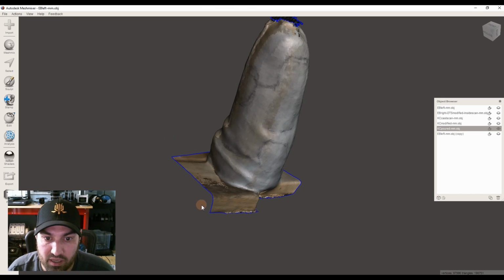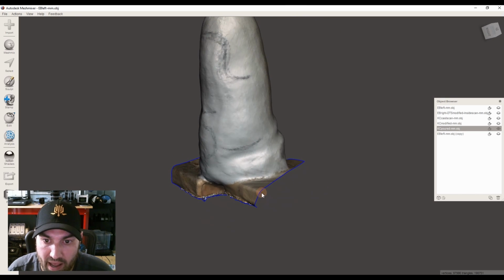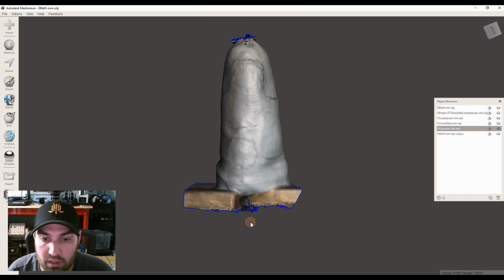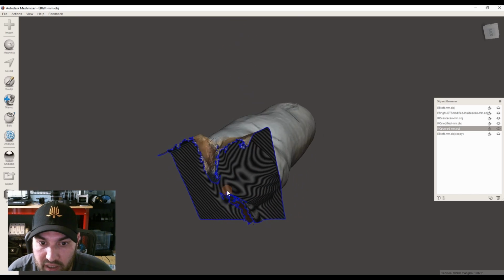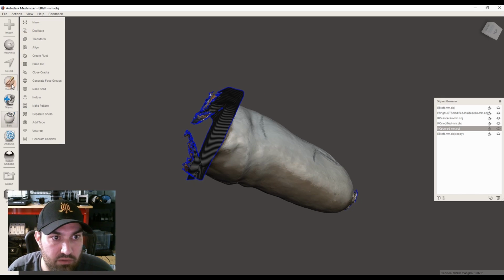And I also had just some blocks of 2x4s here when scanning that it was able to grab onto. And then I actually cleaned up some of this in the Scandi Pro app before exporting that here. But we're going to clean up the rest of this and show you how those tools work and just kind of finish out the rest of the tool set here.